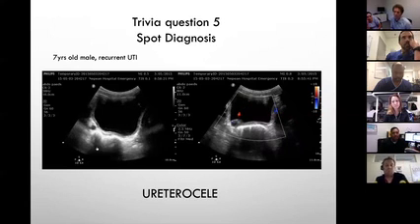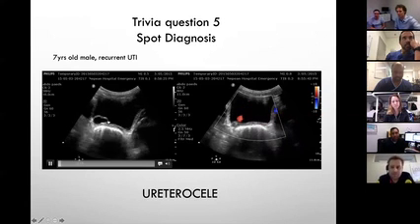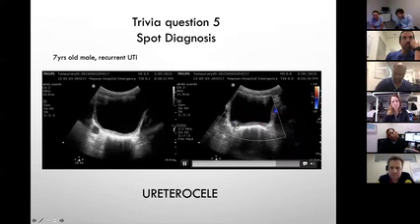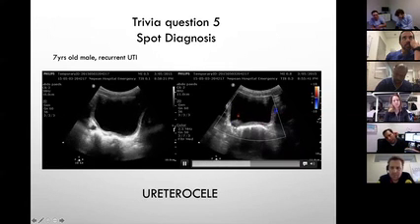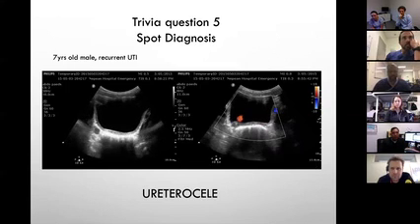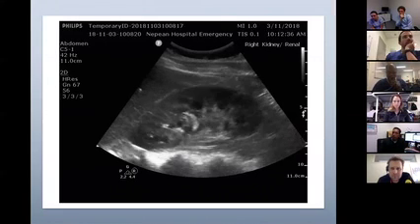All right. So recurrent UTIs, just think about ureterocele as well. It's like the whole ureter is just protruding inside. Once they get a ureteric jet coming out from that, it kind of shrinks down. Pressure goes off completely. All right. Moving on to the next.